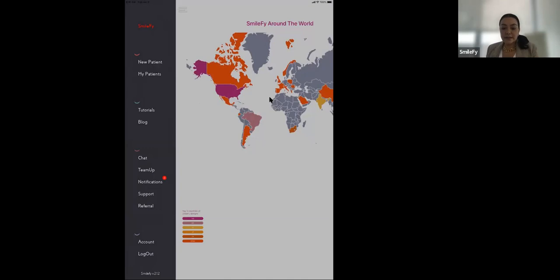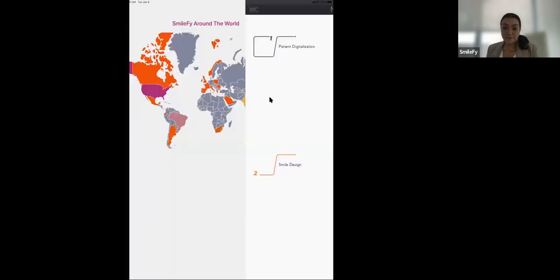So I want you to click on new patient. And then after, I want you to click on try me. Before you start, this is our menu. You have a space for patient digitalization, for 2D and for 3D design. If you receive a patient for the first time and you want to start a conversation, the patient comes to your office and doesn't know if they want to do the smile design or not. This is something that you didn't talk about before, and you want to know how it's going to look like.